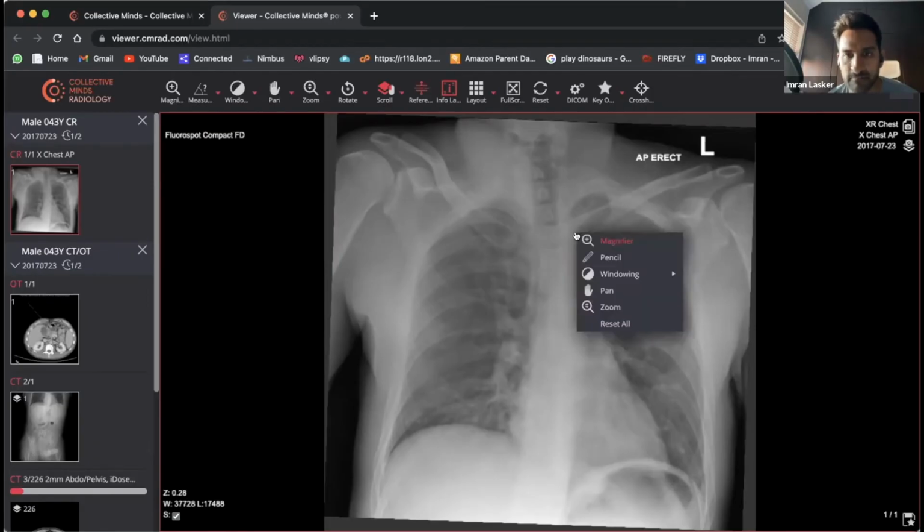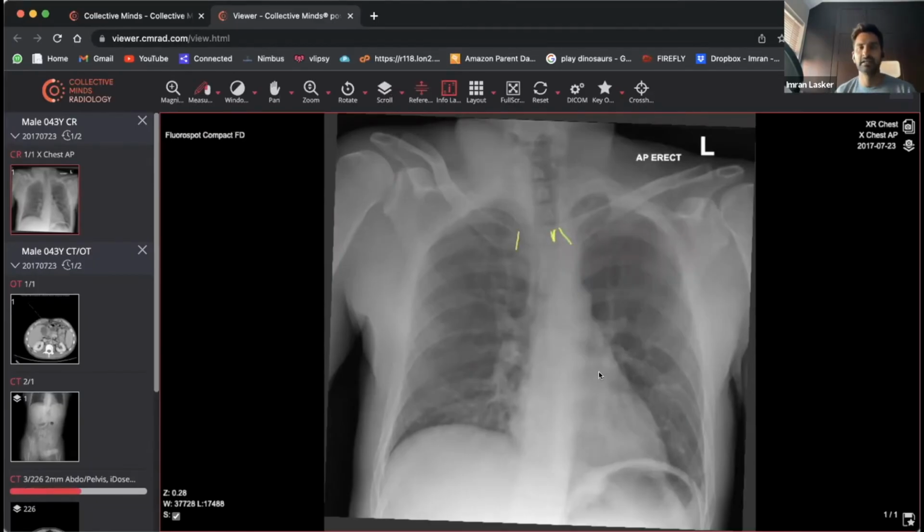Slightly rotated, because if you draw where the clavicle is there, you've got your spinous process sitting there. And that really should be in the middle because the clavicle is the most anterior aspect of your body, the spinous process is the most posterior aspect of the body. So for them to get out of line with one another happens sooner than something that's right up next to each other.